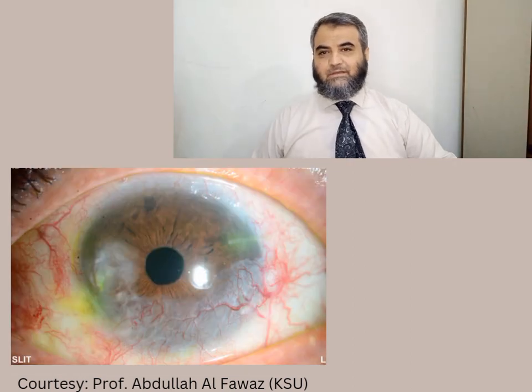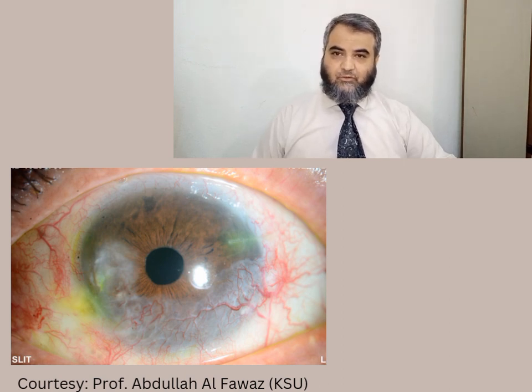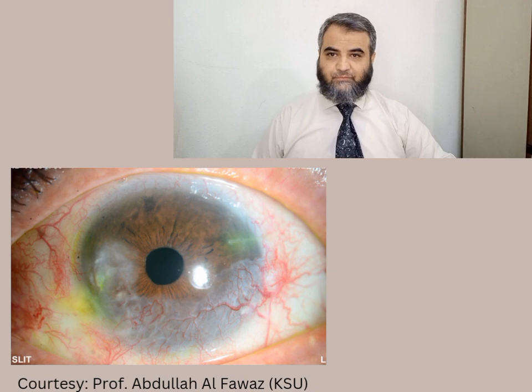This is another anterior segment photograph of the patient which was taken recently. This patient has undergone cataract surgery, so it's now pseudophakic, and you can see the vascularization is all around, but at 9 o'clock you will see some regression of the vessels. This is because of the treatment we have given, which I will discuss later during my presentation.